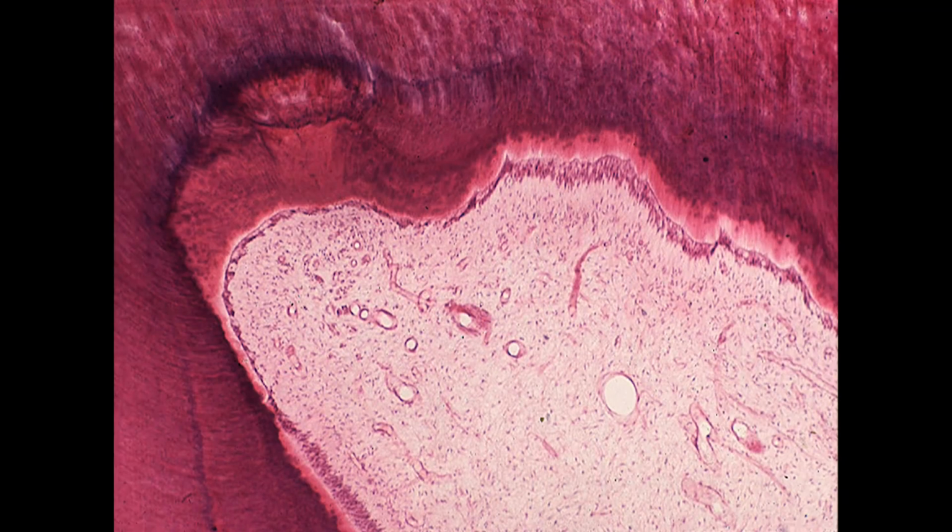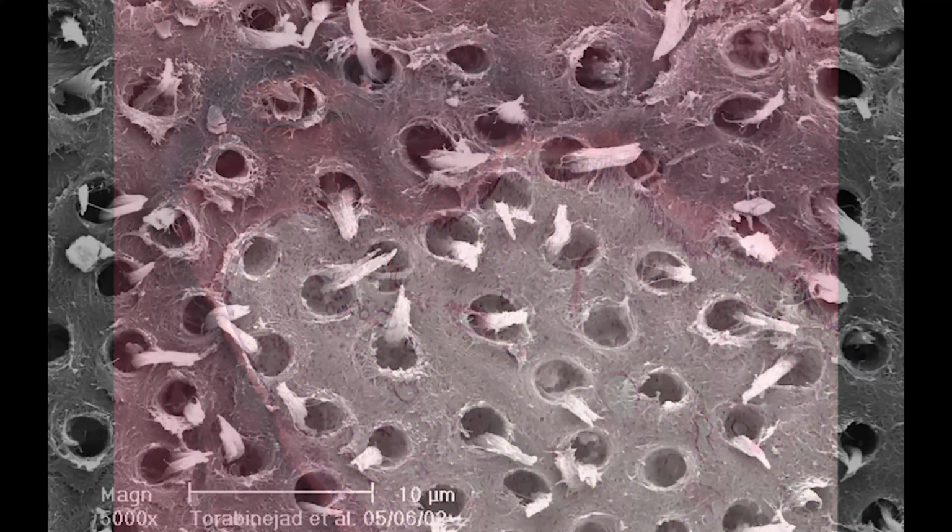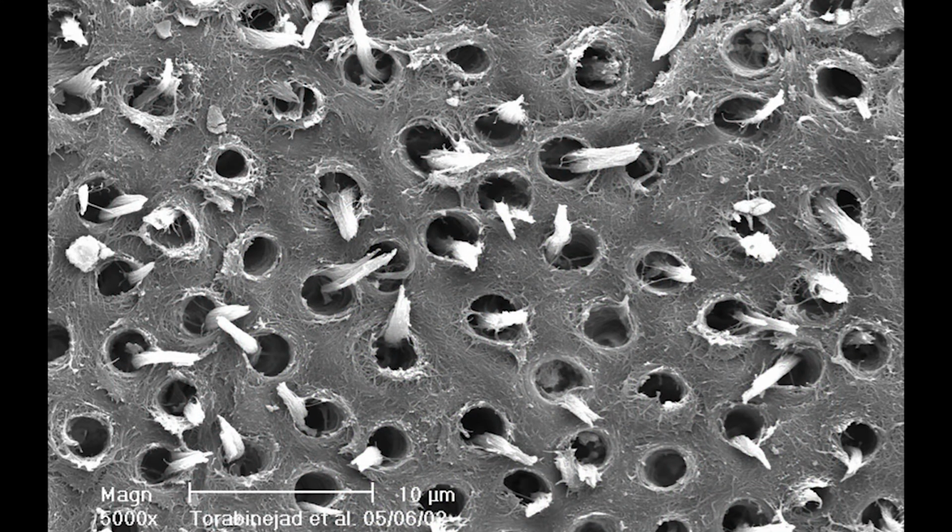Pulp testing device. The dental pulp is a loose connective tissue in the center of the tooth. The main function of the pulp is to form the dentin that surrounds the dentin-pulp complex. The dental pulp contains numerous nerve fibers that extend into the dentinal tubules.